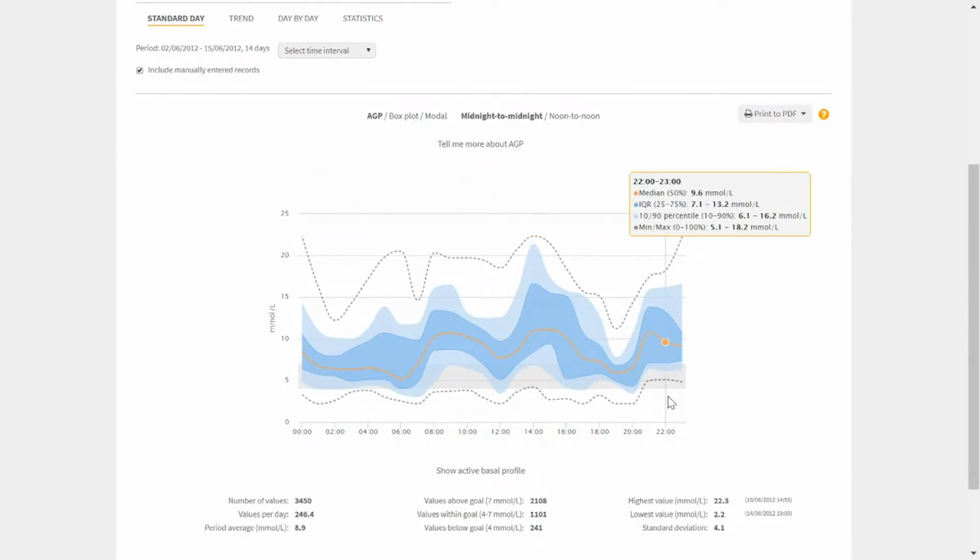So in an area like this one, so at 7 o'clock in the evening, we're able to see that the grouping is much tighter, so the control is much more consistent at this specific time of day, with a narrow interquartile range and an also very narrow 80% of results within that space. Even though the maximum and minimum are more dispersed, statistically we have a much higher proportion of results that are closer to the median value.